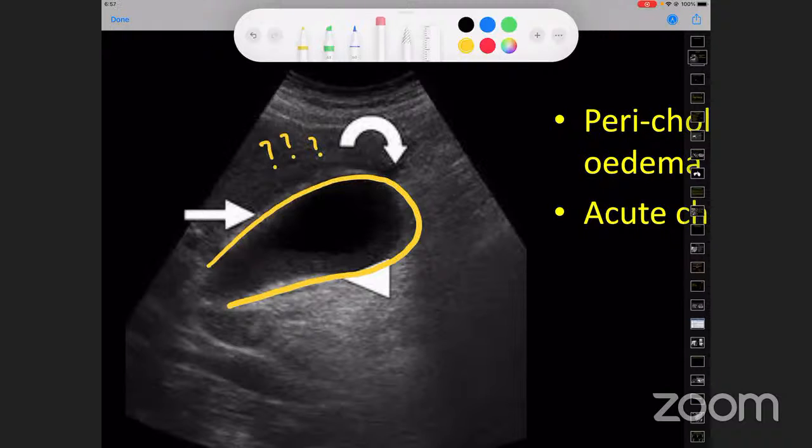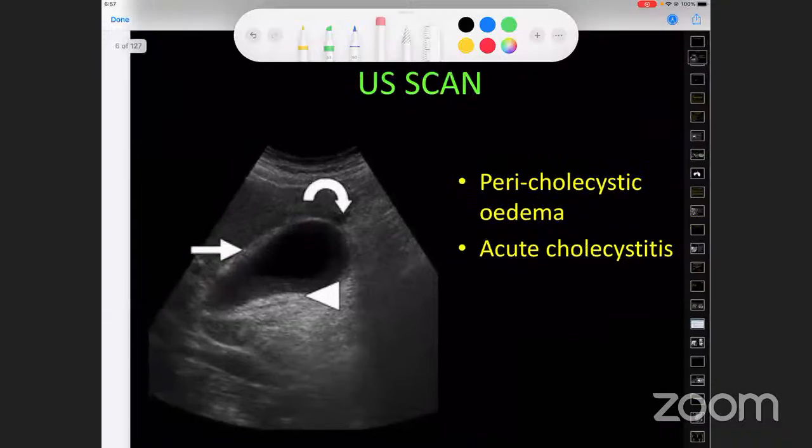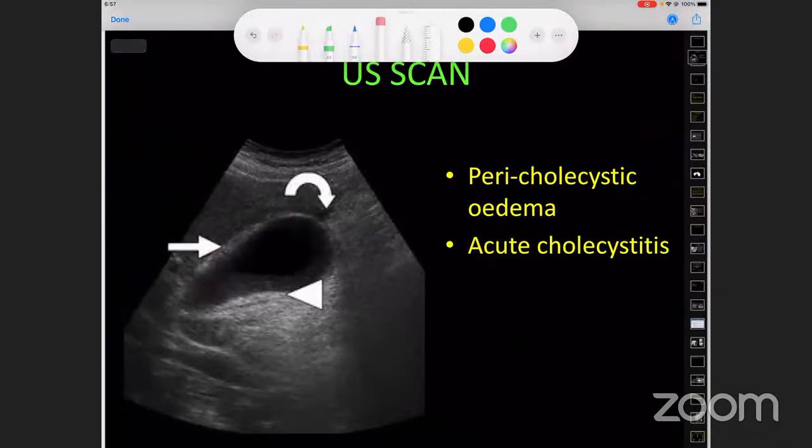Yeah, actually, two things. In a setting of acute cholecystitis, we can see a loculated fluid collection in the pericholecystic region, in the pericholecystic liver bed as well as in the subhepatic region. Second, we can also see the seepage of bile because of the acute obstruction, across the gallbladder wall into segment 5 or segment 4B of the liver.